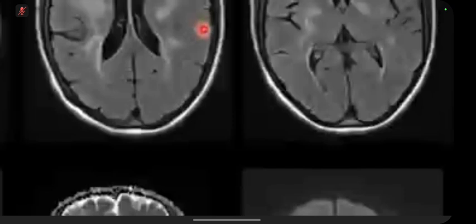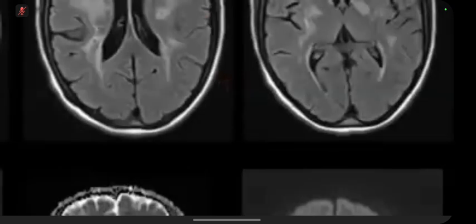Okay, now this patient is SLE. So you did a scan. And what are the findings? Is it MS, or you can explain it on some other grounds? I don't think it's typical configuration or morphology with regards to the hyperintense signal, although it is predominantly periventricular. There's also basal ganglia involvement, and I wonder in the context of SLE whether this is a vasculitic picture, so more of a kind of small vessel disease pathology, or vasculitis.